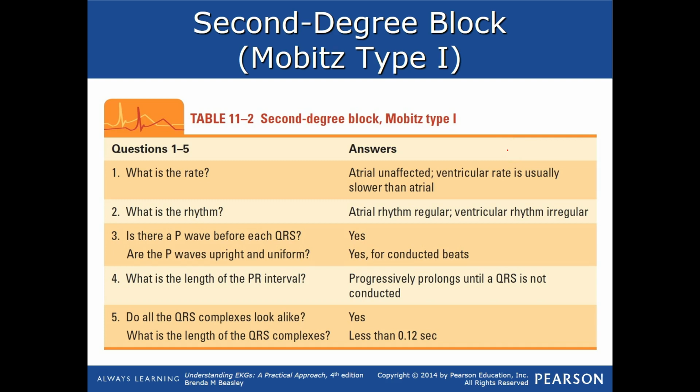So type 1, just delayed. Now we move on to second degree type 2.